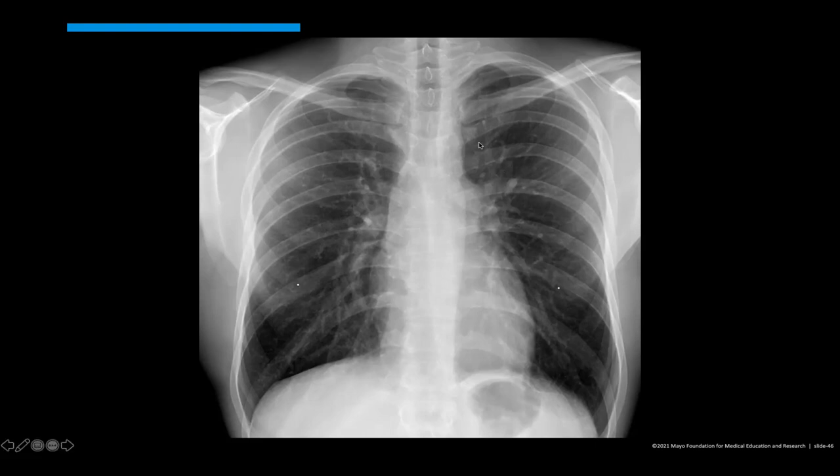It turns out, if you look very closely between the aortic arch and the left pulmonary artery, there's an abnormal contour. You can see a figure of 3 sign. This is a patient with coarctation. Then if you look very closely, there's a very subtle rib notching bilaterally.